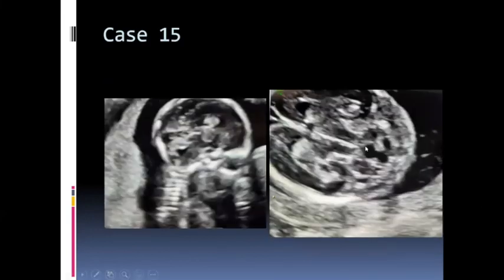So what is this? This is a cystic structure in the posterior fossa with a keyhole-like appearance. But the size of the posterior fossa is normal. This angle, the vermian angle, is also normal. The vermis is not lifted above. So it's a tiny cyst in the posterior fossa, which is communicating with the fourth ventricle. So this is a case of Blake's pouch cyst.